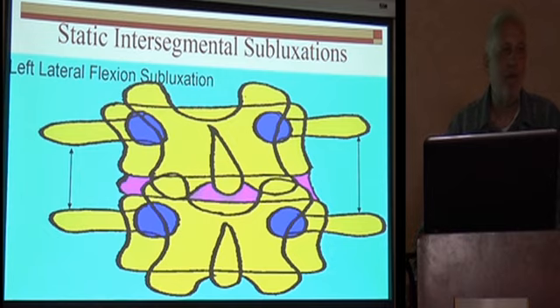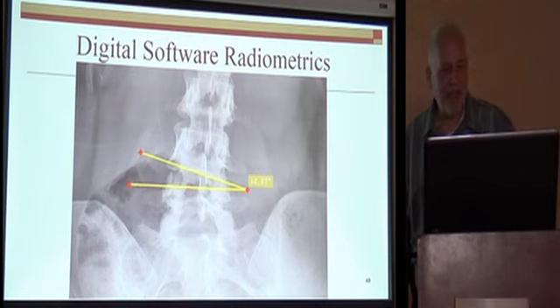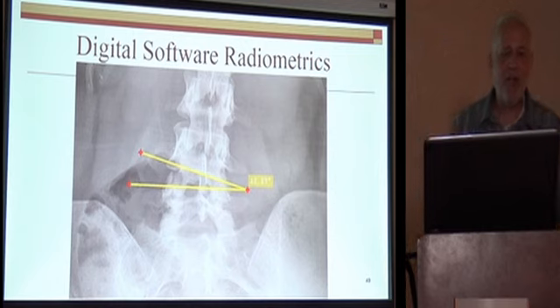Distance on the right, so the vertebra is tilted. You could also draw lines on the bottoms of the end plates of the vertebra as well. Here's what I did with my system, and that's one of the things I love, that Cobb's angle. You can click, run along the bottom of one, click again, run along the bottom of the other one, hit a button, and it shows you how many degrees.